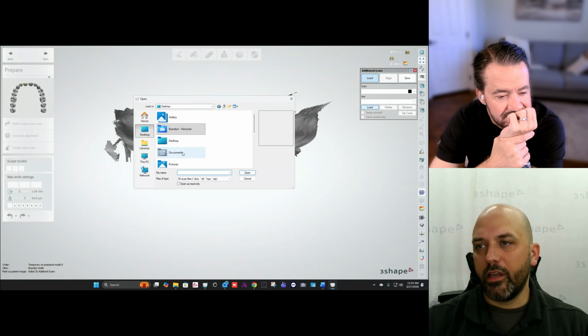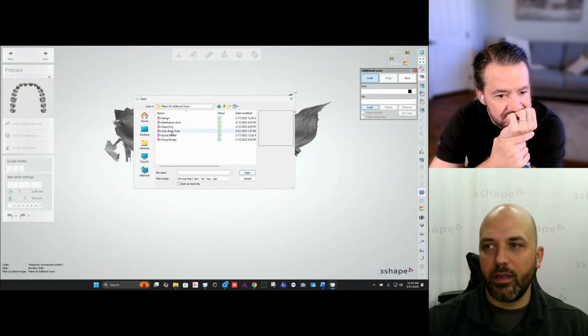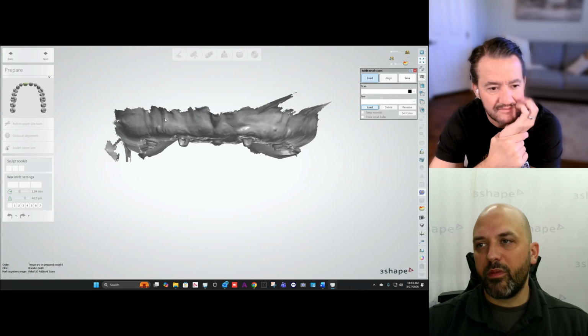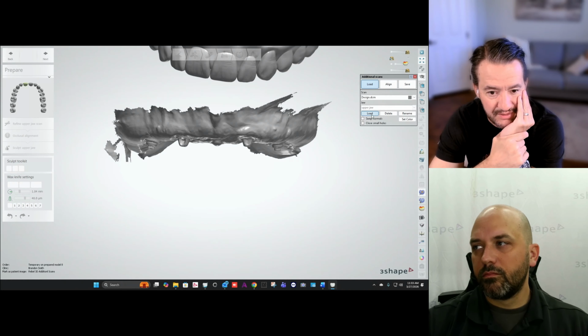And then I'm just going to go back to that folder, and I'm going to start pulling in all of my scans here. So I'll just start from the top of the list. Gotta pull them all in one at a time.